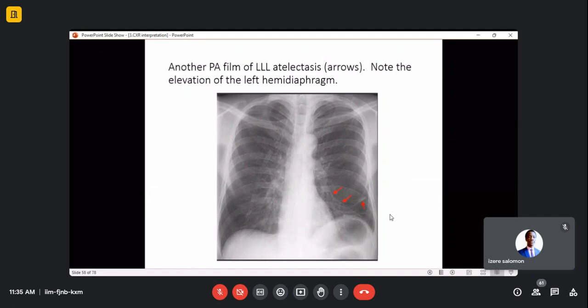Yes. On the right lung, there is a tubular structure going through the lung, throughout the lung. Tubular? On the right lung. This is an artifact. It's the catheter on the, no, sorry, on the skin. The patient had a catheter maybe, I don't know, something that was on the patient. Okay.